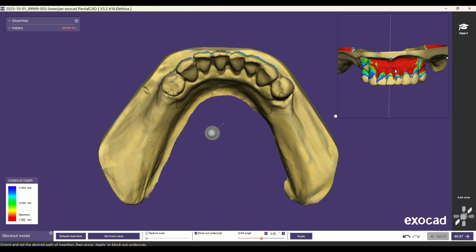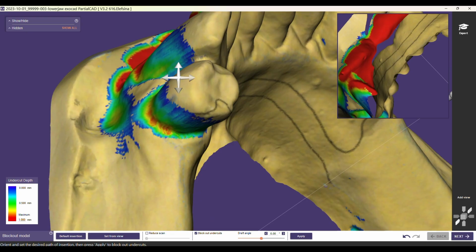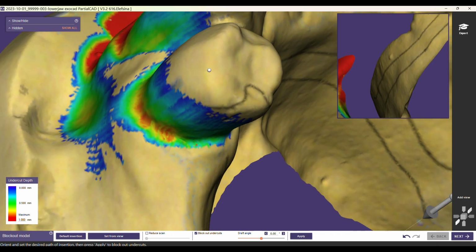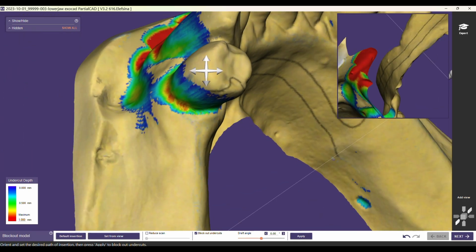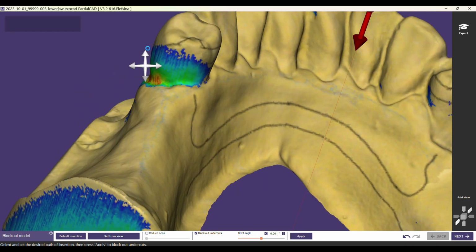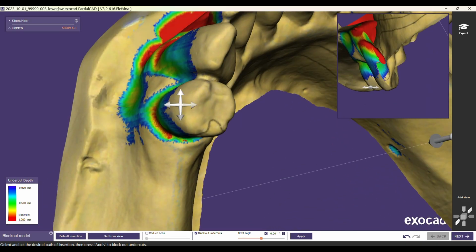However, this is not always under your control as a laboratory. So in these cases, you can see that the undercut starts from the middle and gets deeper as you go down. In case you have a tooth which has, say for example, a very heavy buccal tilt, then the undercut would be placed much more occlusally.